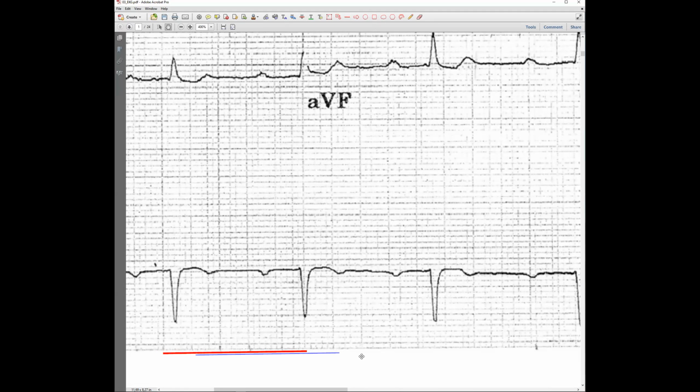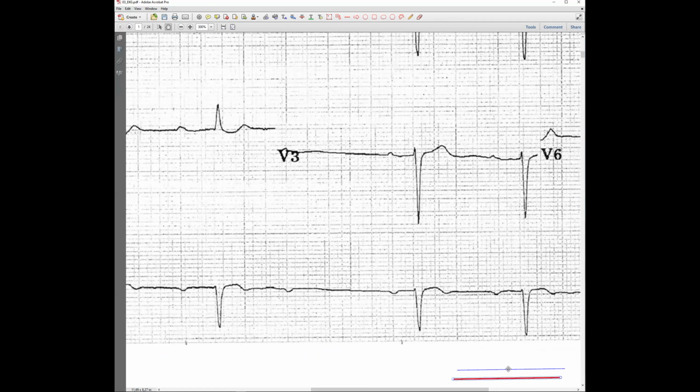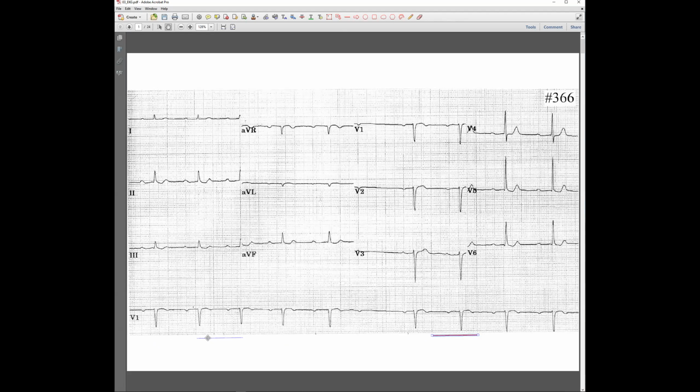Wait a minute, I'm going. Okay, here, because here I can see much better. So 1, 2, 3, 4, 5. That's correct. So now I have 5. Let's see how many times I can have this 5. 1, 2, 3, 4, 5. I would say 6. Up to this point, 6. So from the beginning till this point, we have 6.